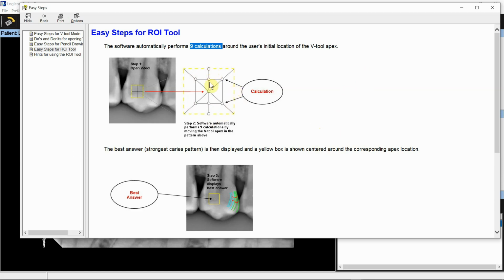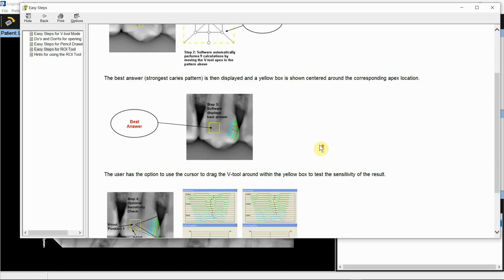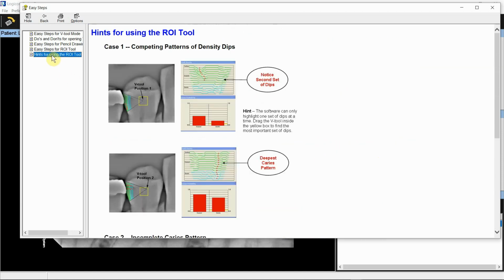So if you start here by holding on to the region of interest tool, you can move it to the 4 corners or you can move it up and down. I kind of was circling it, just looking for the density and dots that were clear. So it's saying that you have that option, and if it's scattered all over the place and it's not a conclusive decision, then you can always discard it and run the analysis a different way. So for instance, maybe there was an overlap that was causing it to be not consistent.